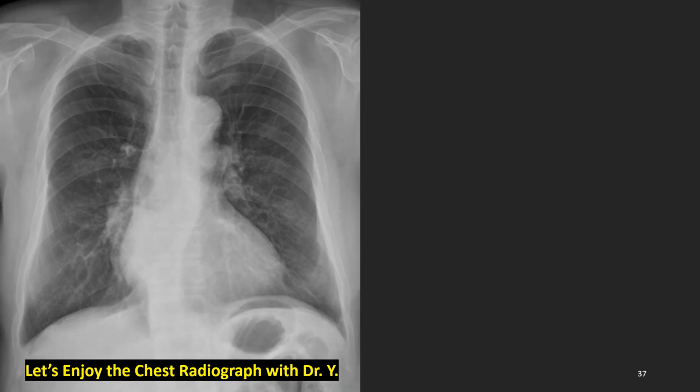How about your condition now? Very tired with these many confusing films, or getting more interested and funnier than before because the cases are so interesting? Please take a deep breath and take a rest for a couple of seconds, and let's go with this patient. Just enjoy the image.